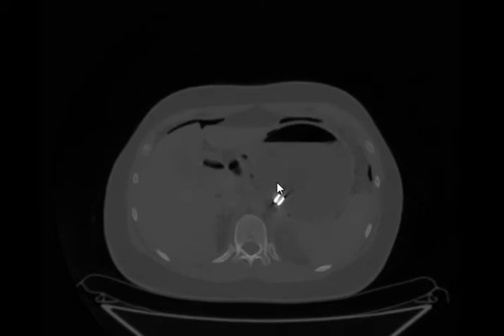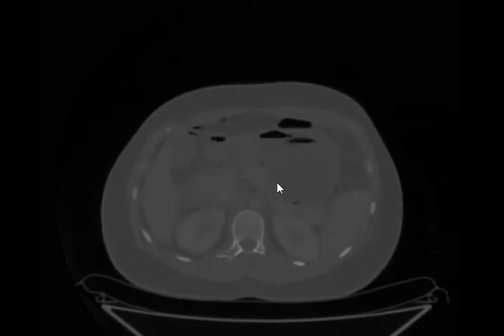Even with contrast it can be difficult. So it's post-intervention, not surgical: post-endoscopic balloon insertion gastric perforation. Post-surgical free air is seen up to 7 to 21 days, provided that every scan it's less in amount. If it is the same or increasing, it's not normal. Okay, nice case, good job.